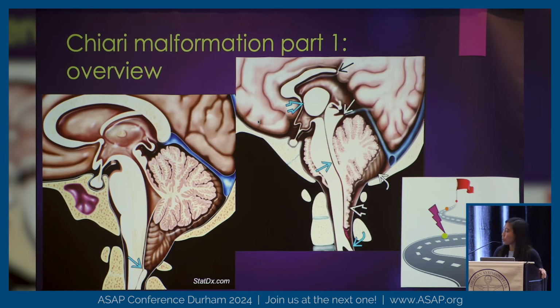So this is the first part, a review of Chiari and imaging. First, we'll get through the anatomy. For Chiari 1, the image on the left I've borrowed from StatDX, which is one of the programs we use with our trainees, a really excellent program online. I don't have a license, but my trainees do, so I borrow their login.